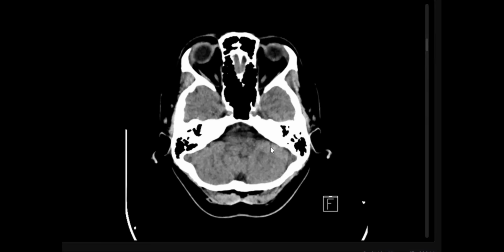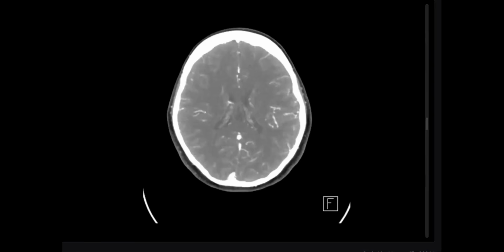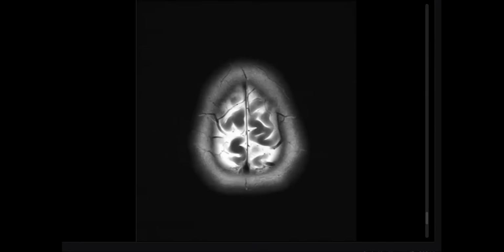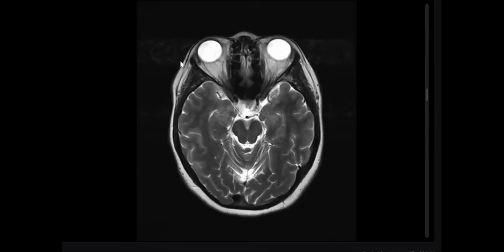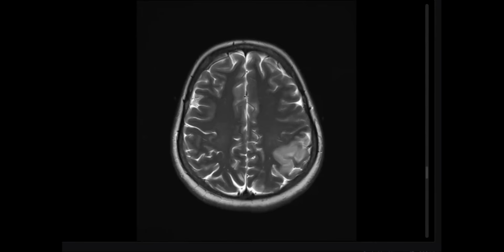Very good. This is the arterial, but this one is venous. So you suspected early venous infarction. What will we do next? I will do venography. You asked for venography, it was unremarkable. What is next? I will do MRI, DWI images to see the infarct, and also MRV images. Now, on T2 weighted images there is hyperintensity in the aforementioned area in the superficial part near the vertex on the left side with associated dense cortical vein. Very good.